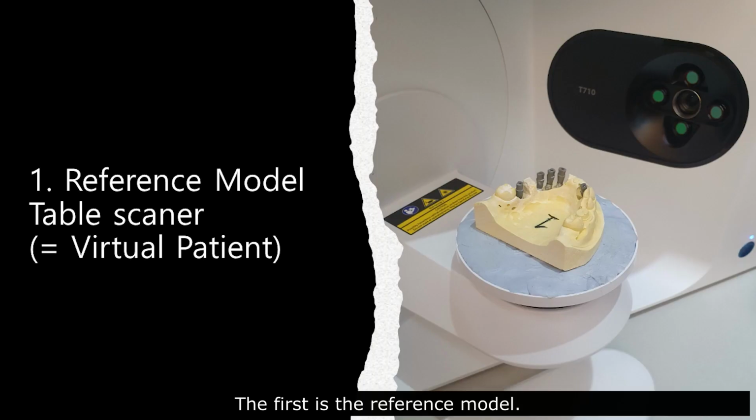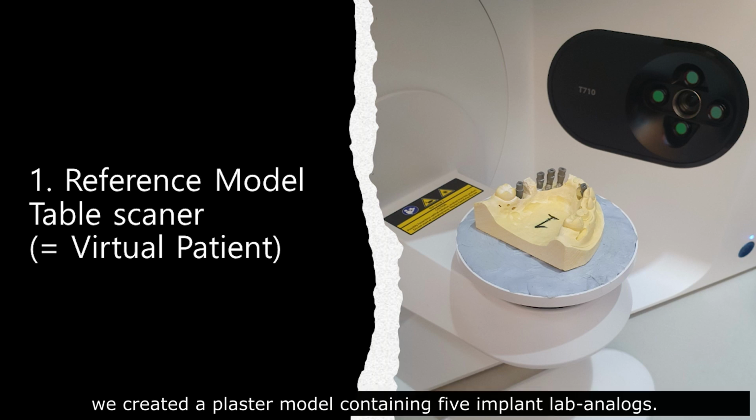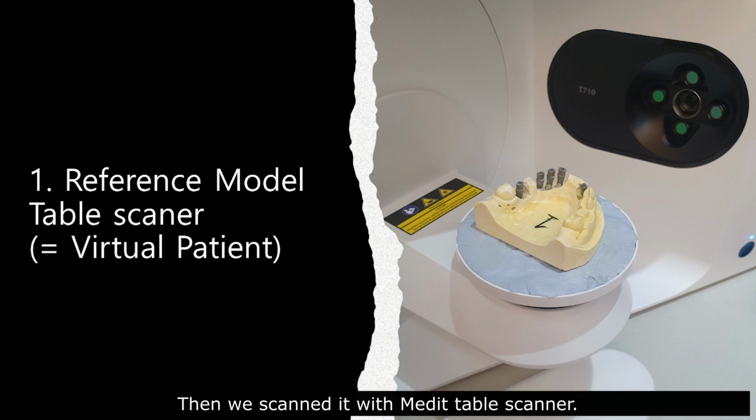The first is the reference model. For the reference model, we created a plaster model containing 5 implant lab analogs. Then we scanned it with Medit table scanner.